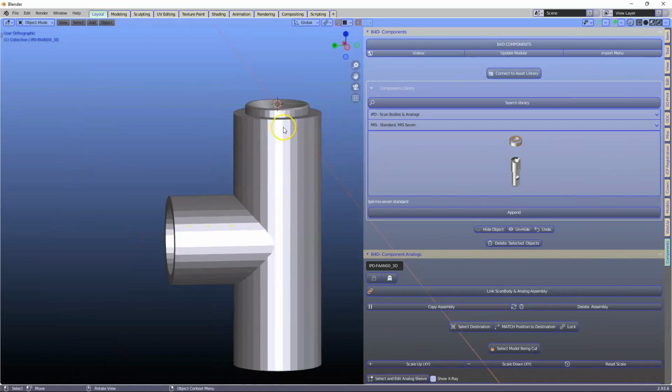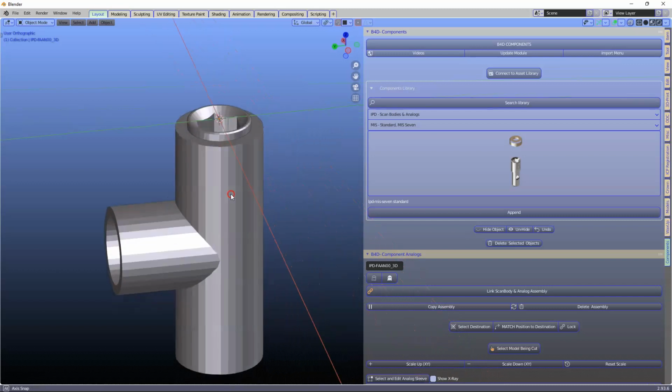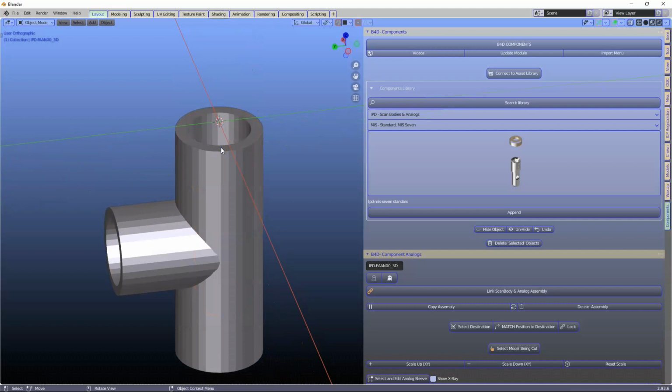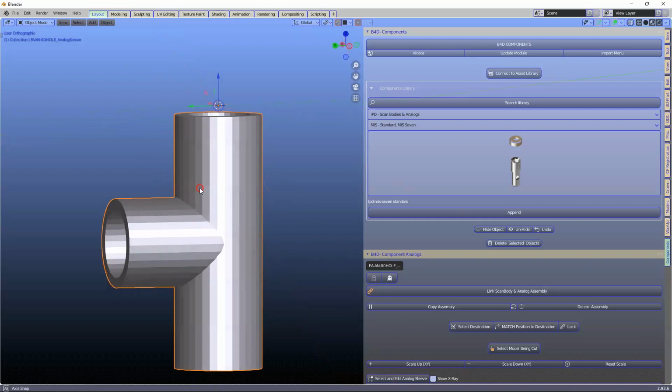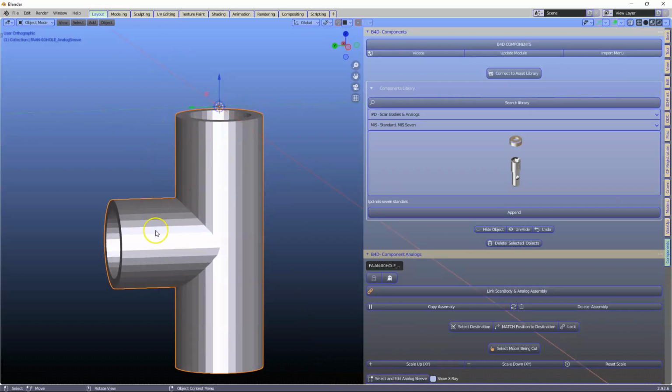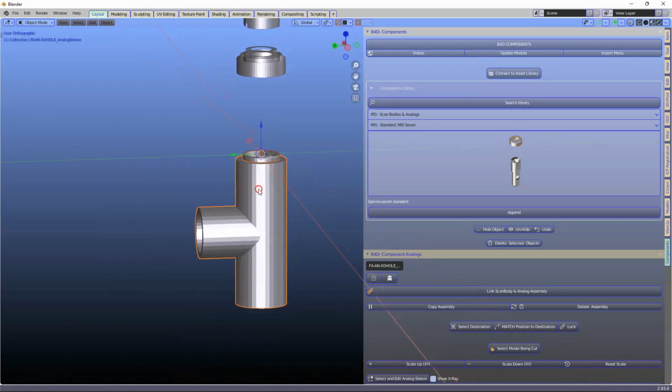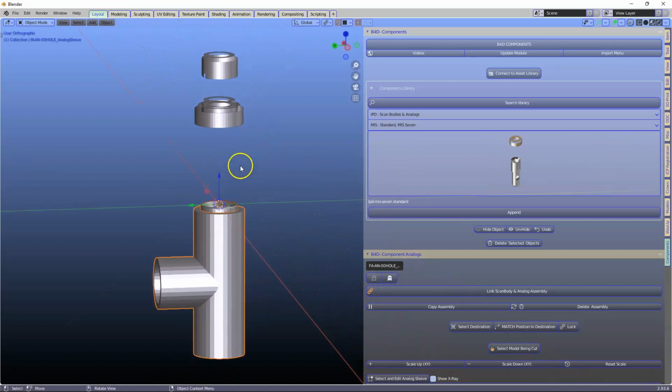Now this will then all be embedded inside the model. And here is the actual analog, so I'm going to hide this, and these tubes become part of our structure. Now these tubes have been made by Blender for Dental, so we do have videos on how to make these as well with your own implant system.